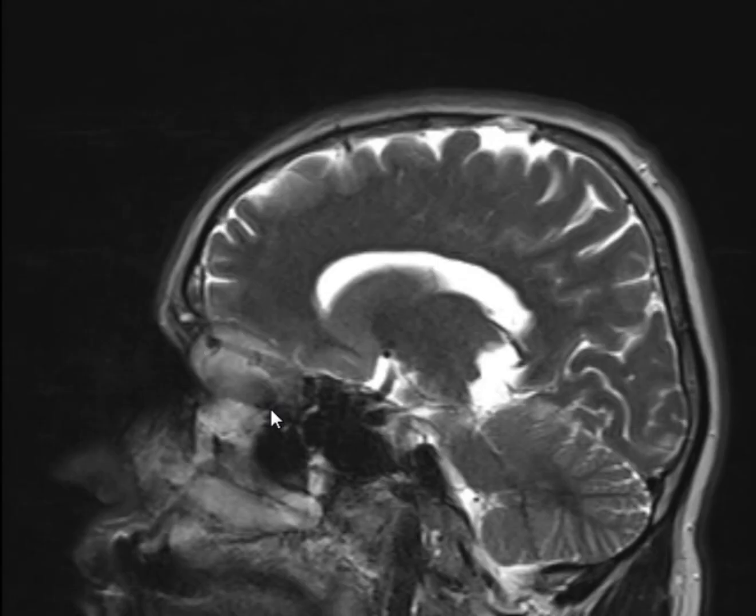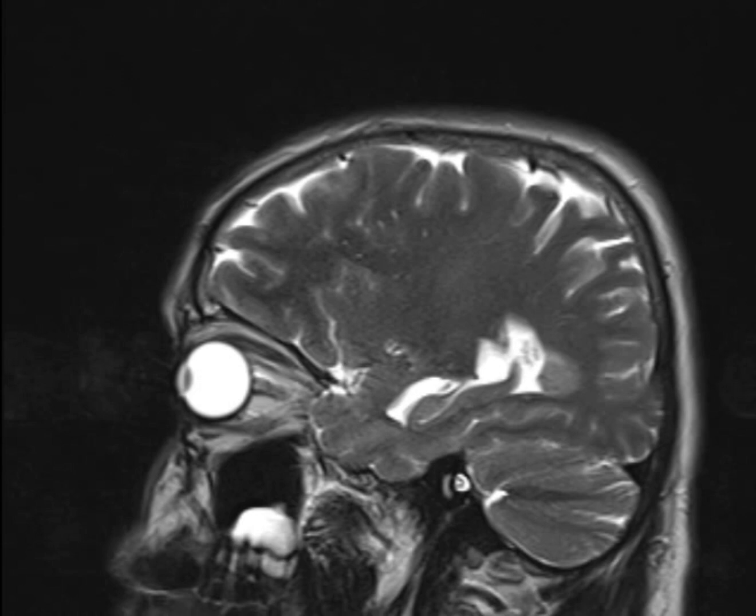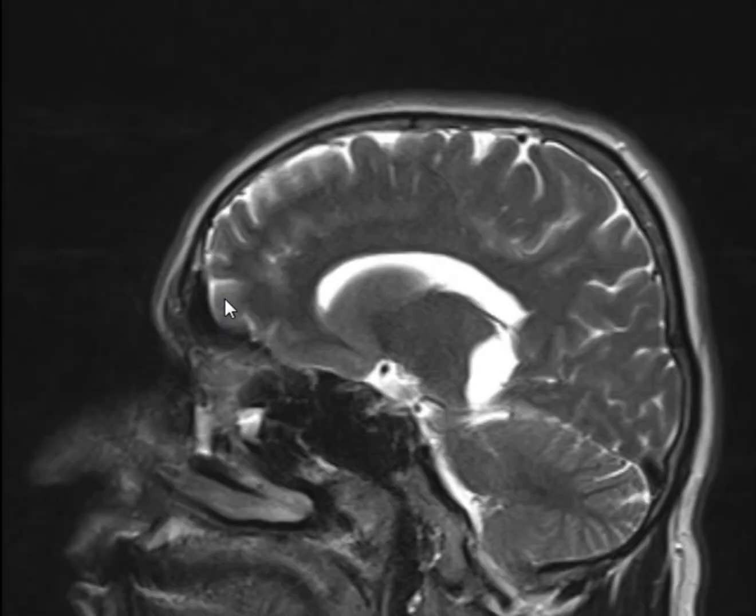So what do we have here? Let's help you a little bit. Okay. Contrast. Give me a sec. Contrast for what? Where are the images? Anything wrong?